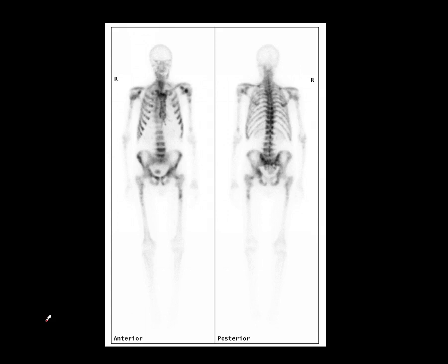So, in the last video we spoke about metastases as random focal areas of uptake in the skeleton, but what happens when a patient has widespread metastatic disease? The number of metastases can be very great, like this patient here who has extensive metastatic prostate cancer. But you can see that we're still able to identify some, at least, individual metastases in this case, multiple focal areas here, but you can see how they are just about beginning to blend in together.